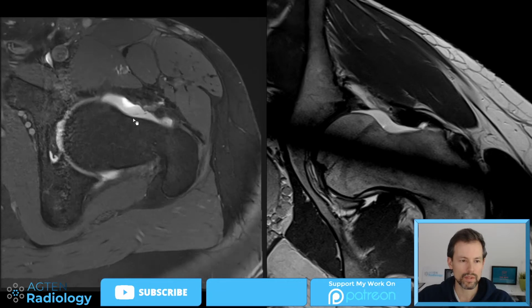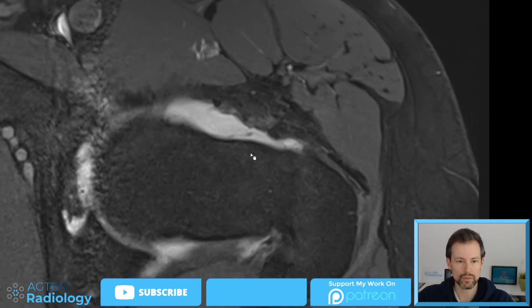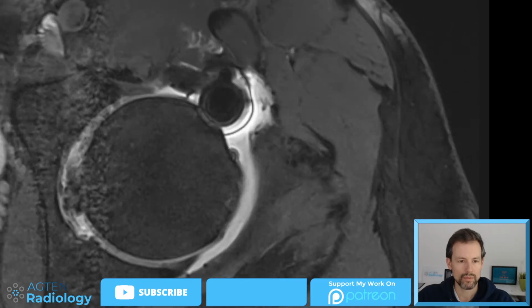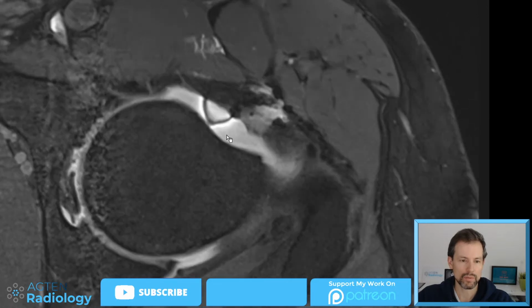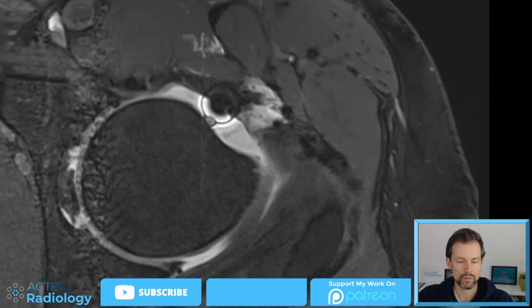So there is an adhesion, as you can appreciate. This one, and maybe some down here. I think that's what they actually meant. And the femoral neck covered by a thin membrane with patchy islands of new cartilage formation, it's not something we can or should see. I don't think we should try to see it.